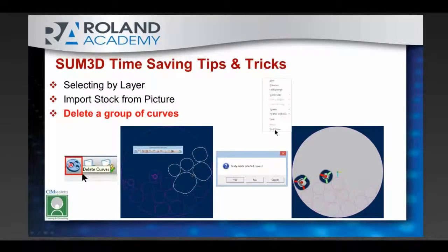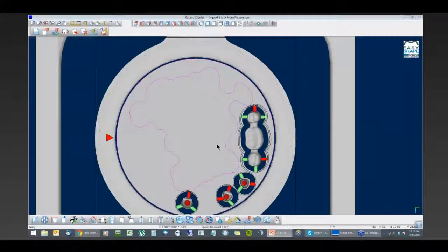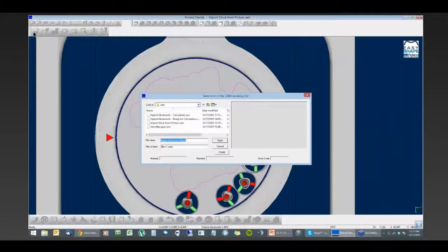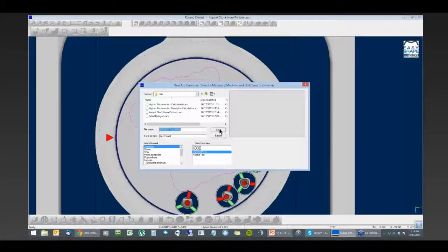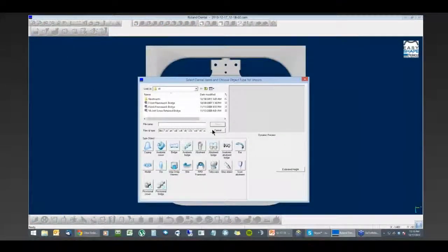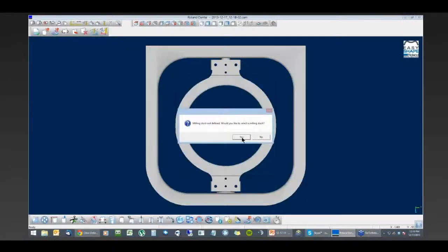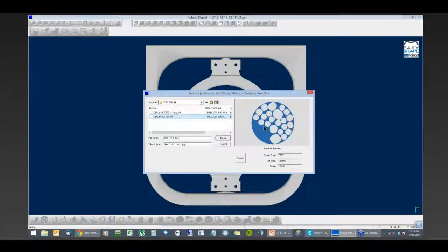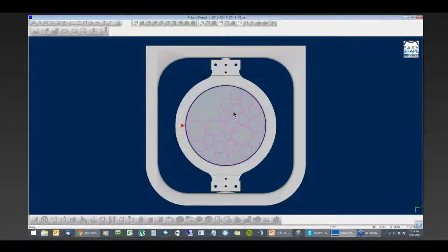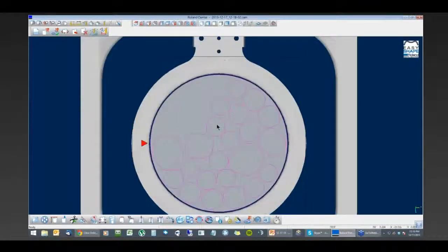And just quickly to show you that in the software, I'm going to start a new file here, and we'll just go with the default settings, and I'm going to import a disk. I won't bother importing any items at this point because we're not actually going to mill anything, but just to be able to show you how we can get rid of some of these items. So I'm going to use this test blank that I've created. All right, and let's say that these 3 items right here did not mill out at the top.